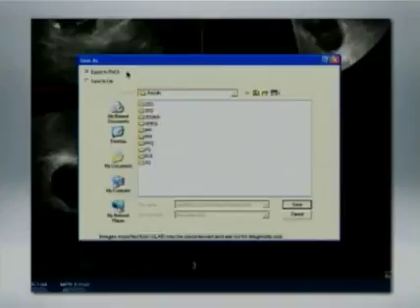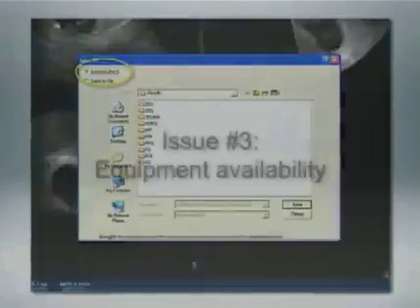And this ability to do this post-processing on the PACS workstation has really been a major change for us. It enables me to use volumes much more frequently than I could before because there's a lot less work to do to actually get the volume ready to post-process, and once I've created the post-processed images, it's easy to get them back to the PACS. So all I do is export to PACS and save, and it's there.